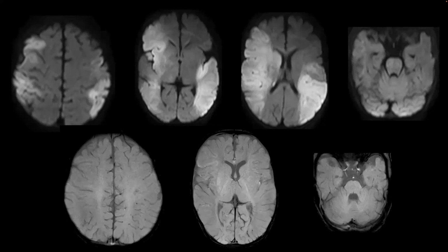Yeah, in a few months' time. Something, Nihaal, I wanted to ask: in the fifth image, second row, second image, these are the GRE sequences. Oh, the second one is also GRE. Okay. So because it shows in the lower panel? Lower panel, second one. Yeah, these are GRE images. All three are GRE. Okay, because they appear to be putamen and thalamic hyperintensity. No, this is GRE.